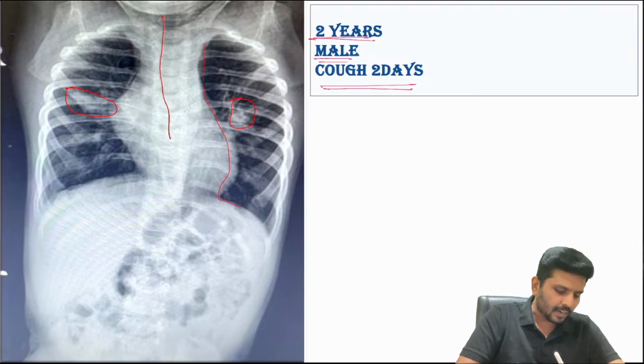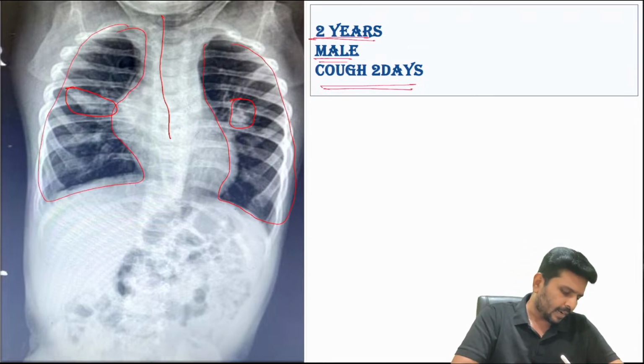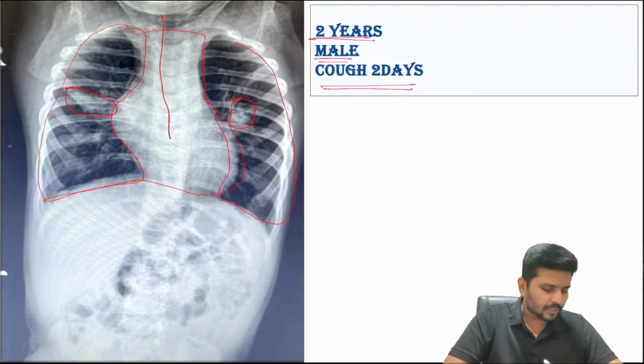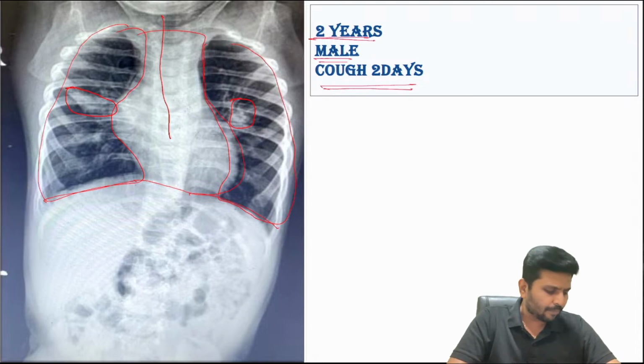Second, breathing: left lung volume is okay, right lung volume is okay. C stands for cardiac. Cardiac is relatively normal size. Diaphragm is normal. So excluding the extras, there is no rib fracture. Is there any subcutaneous emphysema? No.